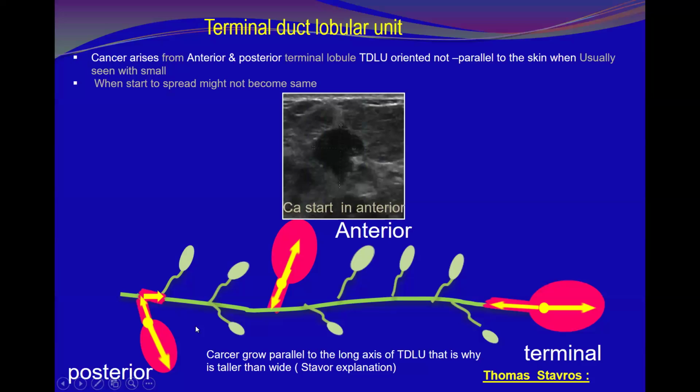Okay. So as we have mentioned earlier, you see, the extralobular terminal duct in the anterior is a bit longer than the posterior one. Do you remember that? So we expect, what do you expect? The cancer in the anterior compared to the posterior. What will happen? Which one will hit the main ductal system first? The posterior one.